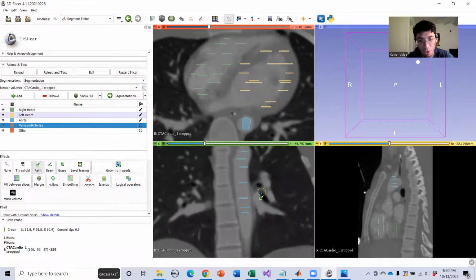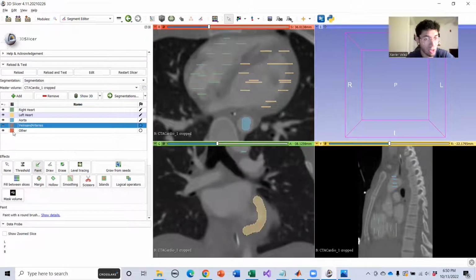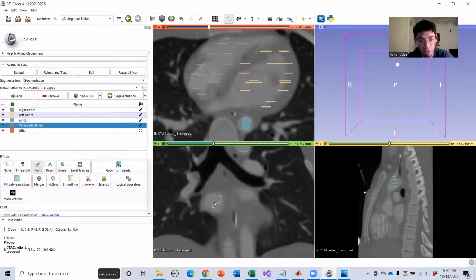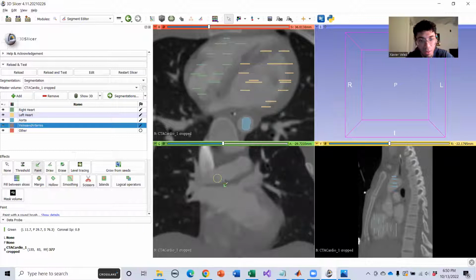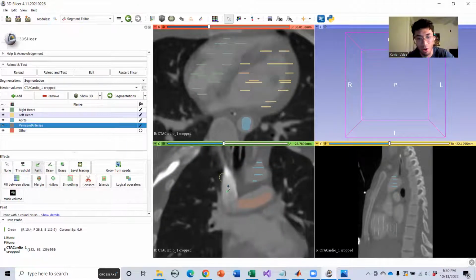And so I'm going to take that guess, and I'm going to say, okay, let's just do it. And so I'm just going to put a little veins and arteries label there. We'll go in here and we'll say, okay, look at you, Mr. Something. I don't know. That might be the pulmonary artery. I'm not sure.